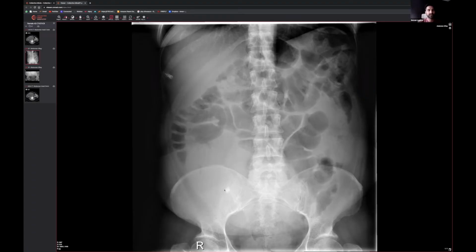In this situation, yes, we do have a calcification, but we don't have anything else, nothing looking like anything being pulled towards it as well. So at the moment, all we have is what looks like a mass, and what looks like a calcified density. Not much more we can say beyond that, and a few people have thrown a few differentials.